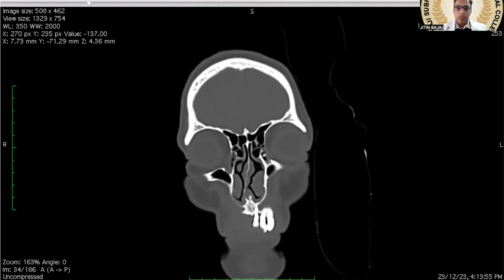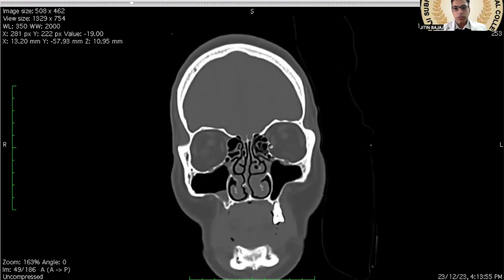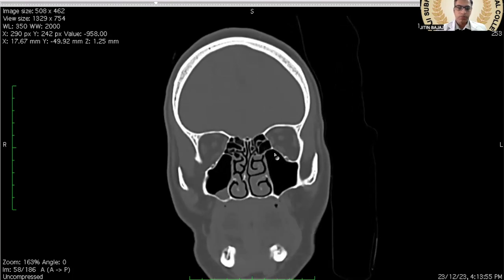One important thing when working in the anterior ethmoidal air cell group is to work laterally, because medially the cribriform plate is very thin and can cause iatrogenic CSF leaks. The ethmoid air cell groups go laterally, so here you have a certain degree of safety. Also, you can see a lot of fat in the anterior part of the orbit, which goes absent as we go posteriorly. You see the fat decreasing, decreasing, decreasing more.